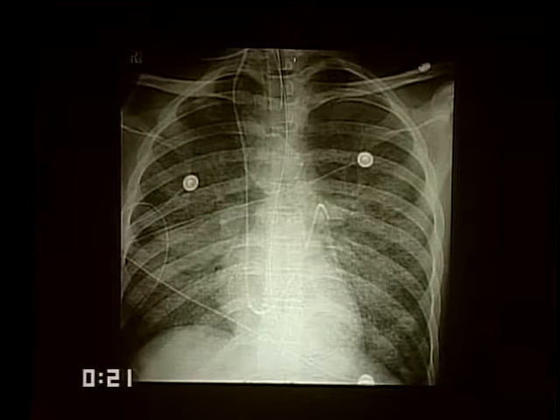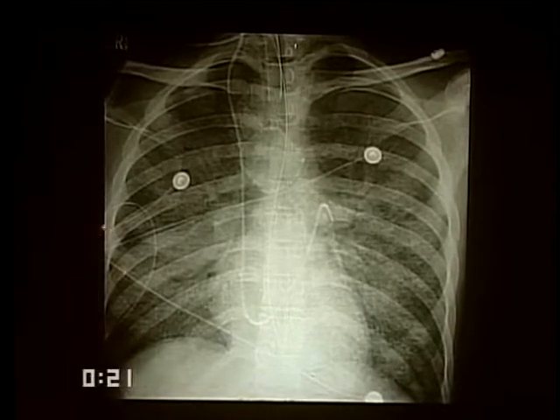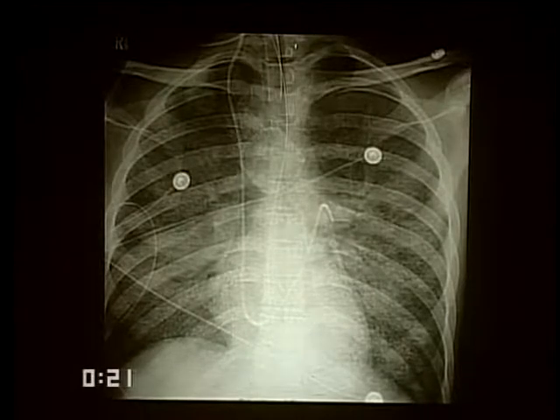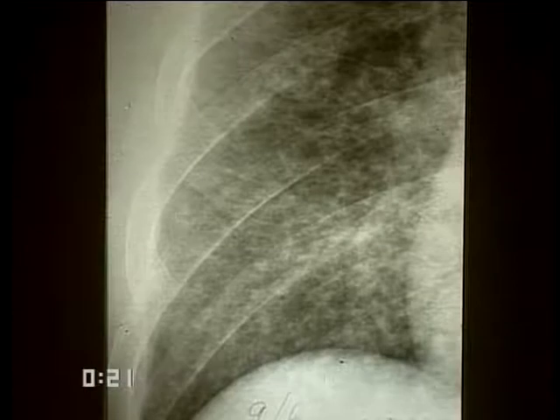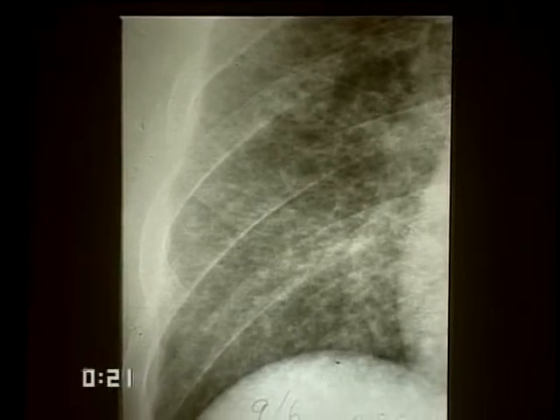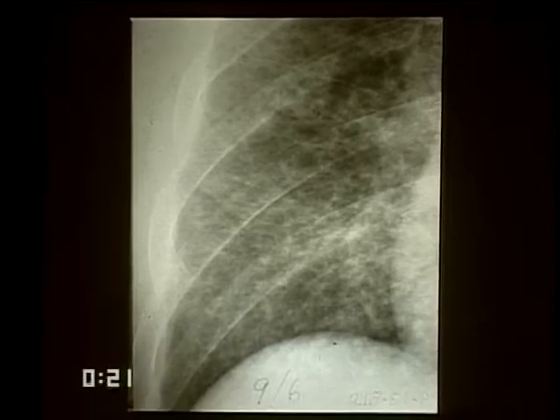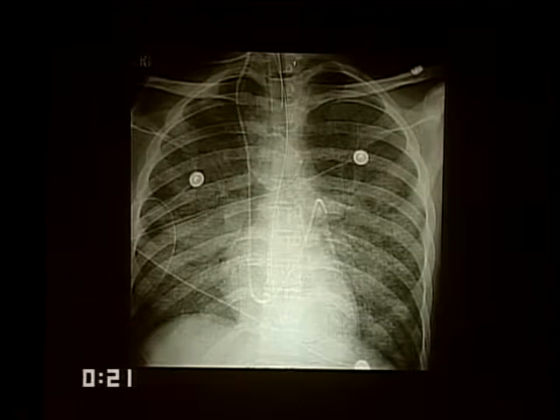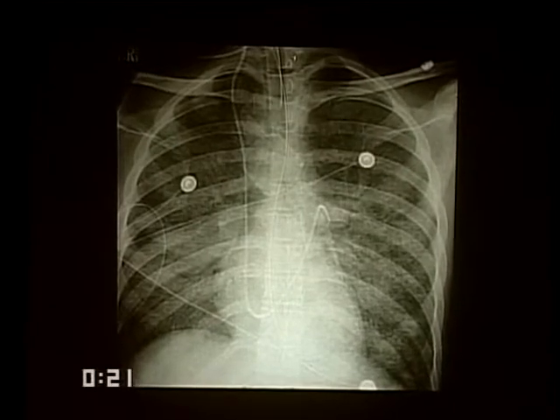PCP, again, may affect the entire lung. Again, this particular case happens to spare the periphery. A variety of viral infections, and this happens to be mycoplasma, can do exactly the same thing. And here again we've got an example of alveolitis, and another example here of PCP, which happens to be dominantly infecting the medulla of the lung.